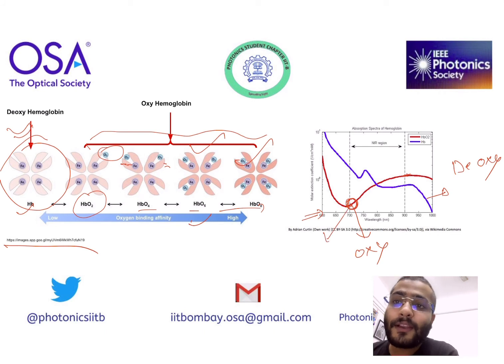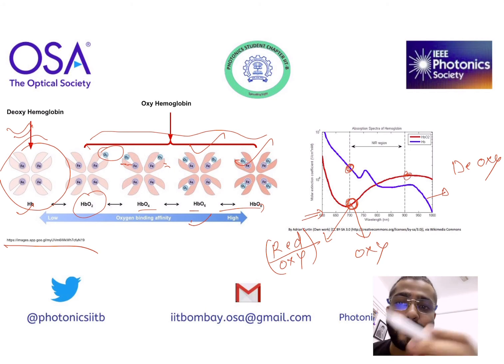That means red light passes through oxyhemoglobin, while infrared light will not pass. For deoxyhemoglobin, red light absorbance is high and infrared light absorbance is low. That means it is less passing in the red region, and transmittance is high in the infrared region.